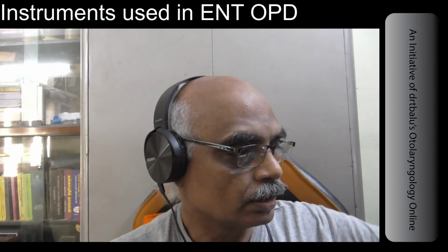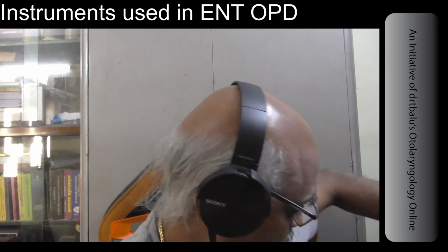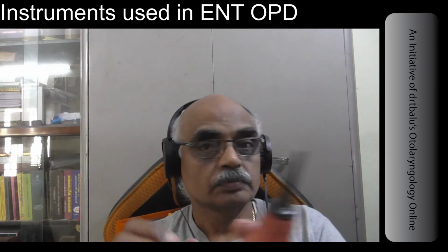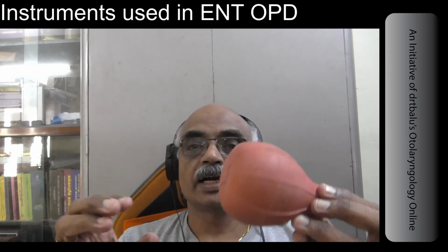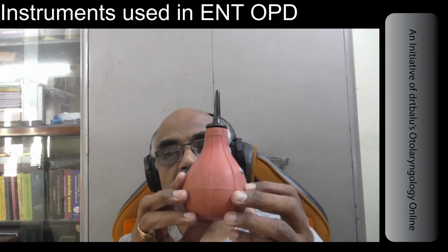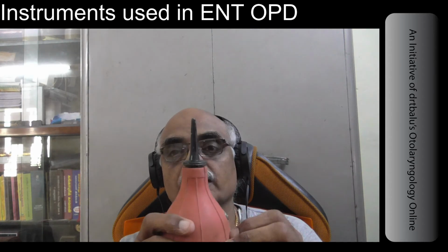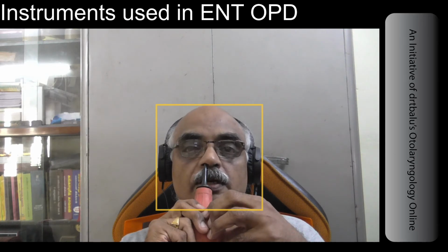Another instrument I'm going to show you is a Politzer bag. This bag, this bulb with a nozzle, is used to treat eustachian catarrh, eustachian block. This is very useful in pediatric patients. You just put it in the nasal cavity of the individual and ask the patient to say KKK.